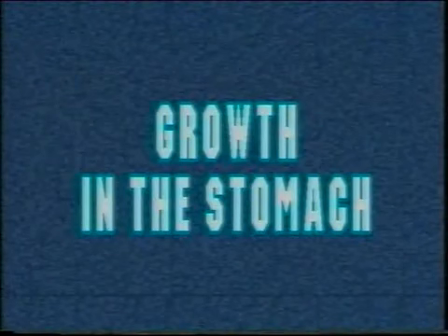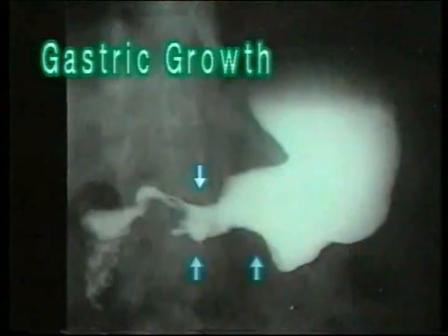Malignant growths in the stomach. Here we see a prepyloric growth. A proliferative growth is seen on barium meal as a radiolucent shadow with irregular borders projecting into the barium-filled lumen of the stomach. Note the arrows pointing to the irregular narrowing of the lumen in the distal stomach. Since the mucosa is destroyed, the borders are not smooth, they are irregular.